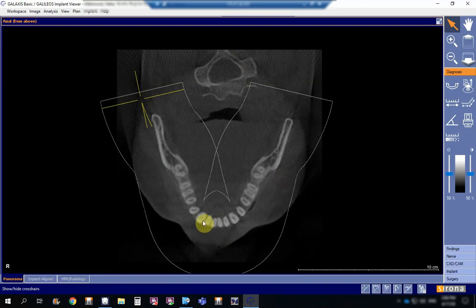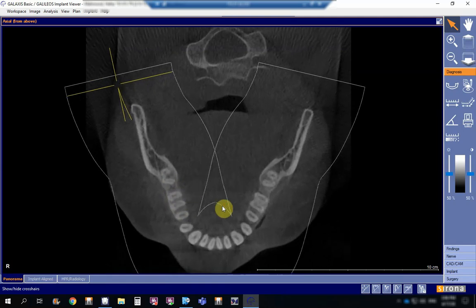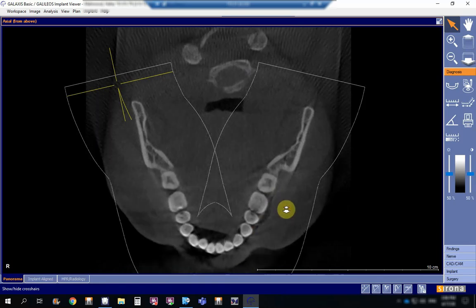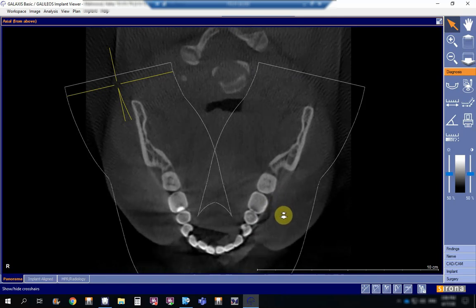See, we've started to go into the level of the teeth. As you can see here, this is the central, lateral, canine. See the pulp canals 4, 5, 6, which has a mesiolingual, distolingual, and a distal root. Let us see if this tooth has two canals. A single canal. This is the 7, and again you can see it over here. This is the 5, the 6, the 7. 8s are not present, and we are going now into the level of the pulp horns, and then we will go up.